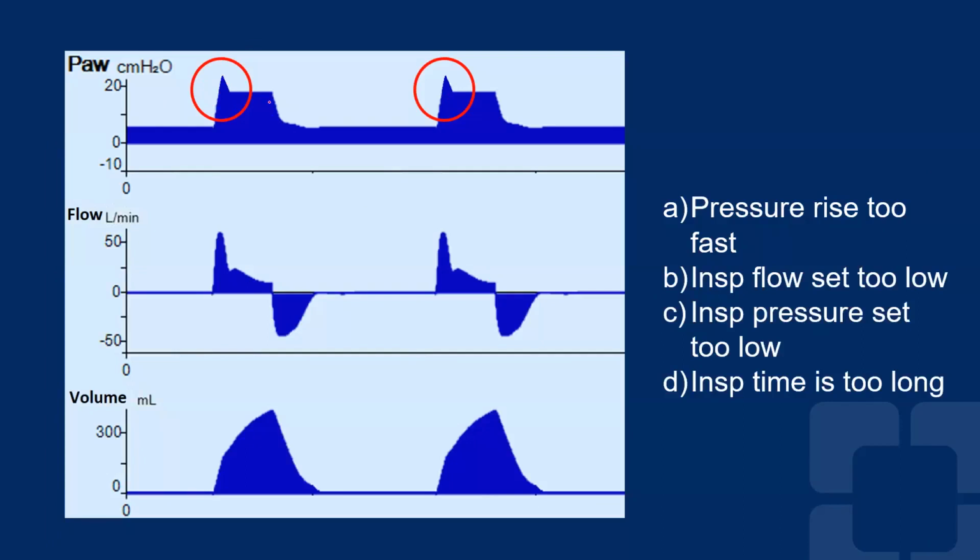But the cool part of this is that if you think about the elastance times volume and resistance times flow, each one of them is a pressure. So if you add these two pressures, it would be the amount of pressure that the ventilator needs to deliver to overcome the elastance and deliver that volume and that flow. The important part here, so these are the loads, what we call the loads. So what we did here for you to understand that a little bit better is, if you see volume, you see the area under the curve that I'm highlighting here in blue.